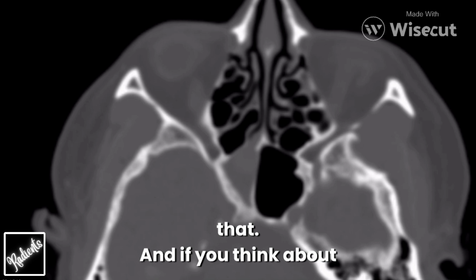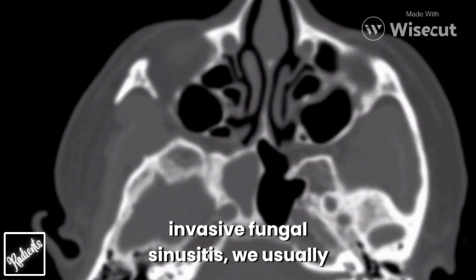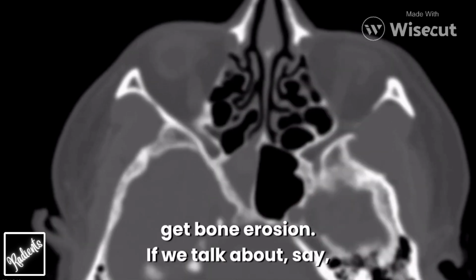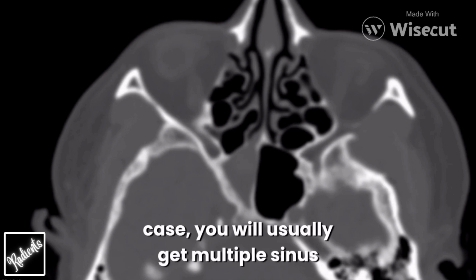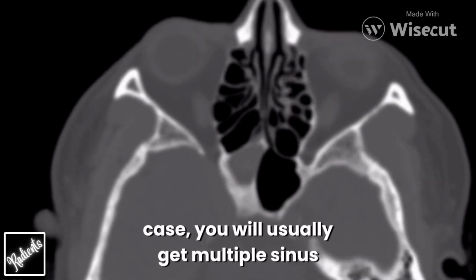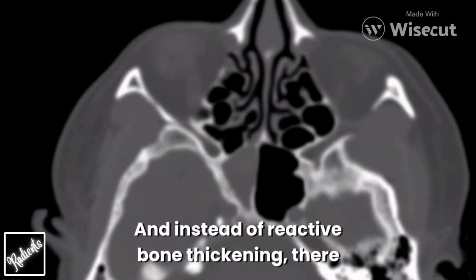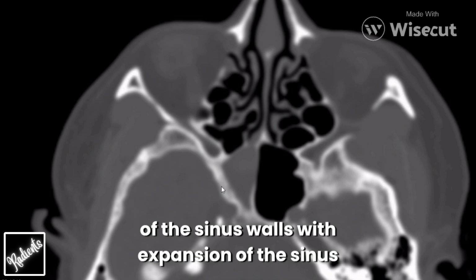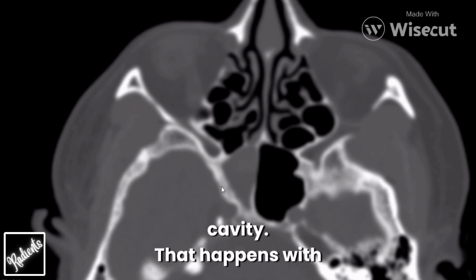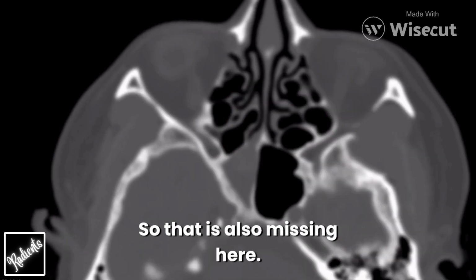And if you think about an invasive fungal sinusitis, in case of invasive fungal sinusitis, we usually get bone erosion. If we talk about, say, allergic fungal sinusitis, then in that case you will usually get multiple sinus involvement, usually in a young patient, and instead of reactive bone thickening, there is actually thinning and expansion of the sinus. So you will find thinning of the sinus walls with expansion of the sinus cavity. That happens with allergic fungal sinusitis. So that is also missing here.